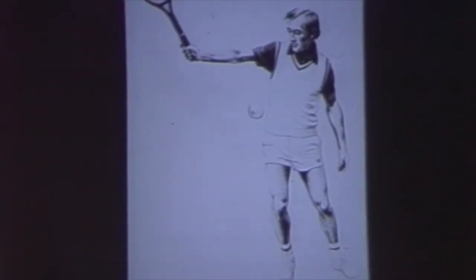A way to develop the knack for that is to put a grapefruit under your armpit and let it drop when you finish high. That's fine, helps your stroke, but makes grapefruit juice on the court. Now, here is a patient who came in whose grapefruit wouldn't drop. If you start low and finish high, that right lung looks normal.